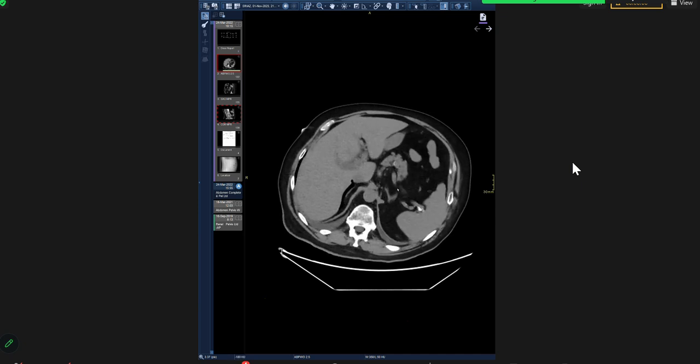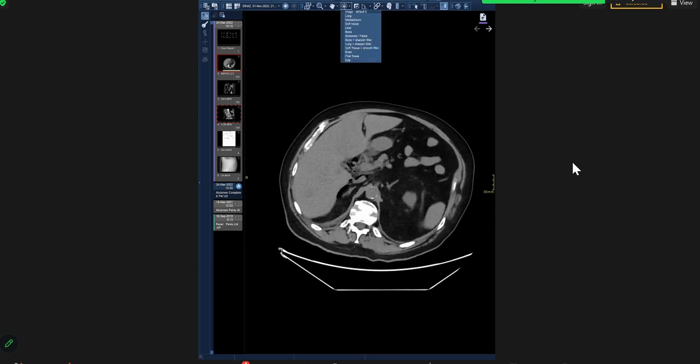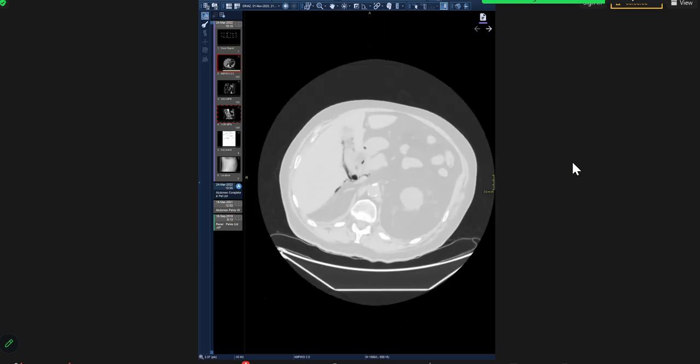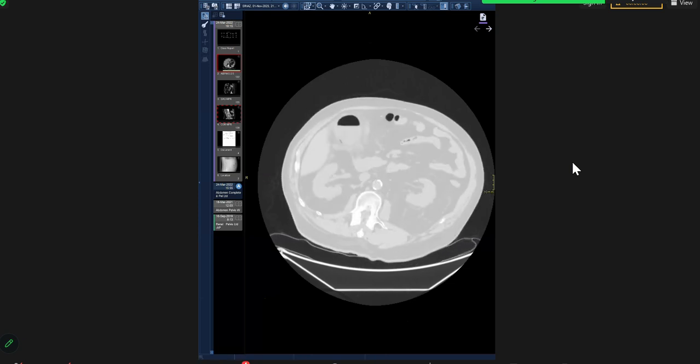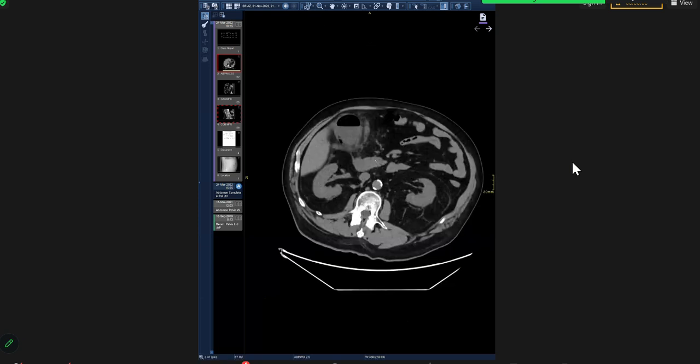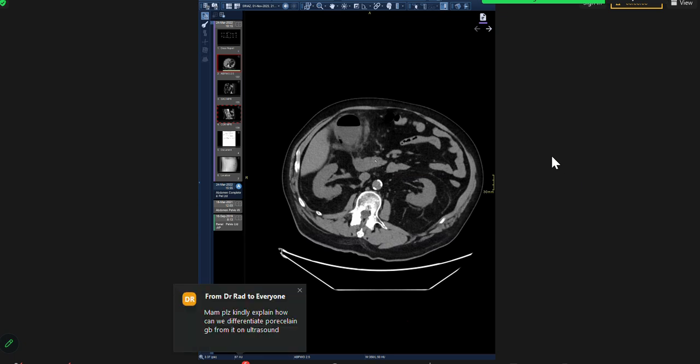So here you would have wanted to see the lung window, right? Yes, ma'am. You see all that. That's it. Okay, so that was your third case. So we're done with the four candidates, and we saw more than the three cases, because I did show you some companion cases, and we had a good discussion on things. So you did really well, and I think that you are kind of ready for the exam. Just need to practice more.